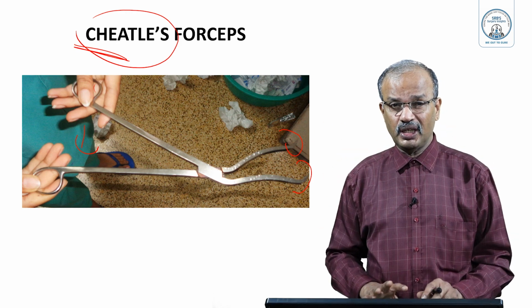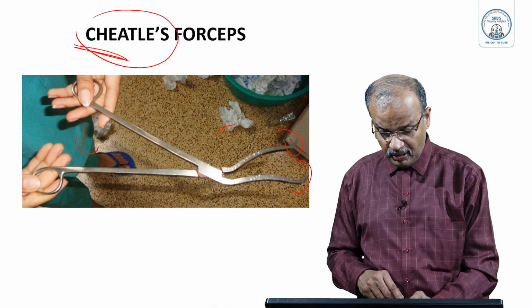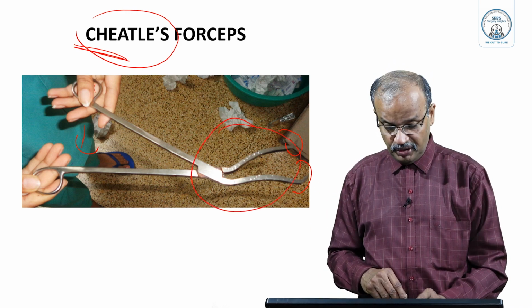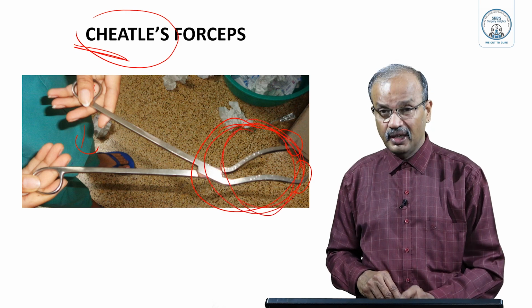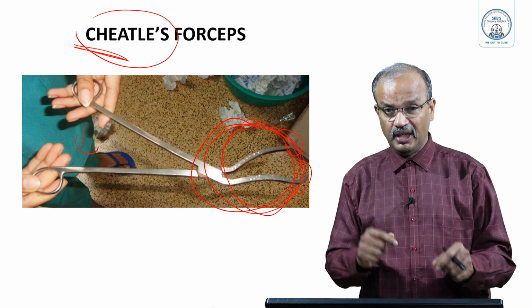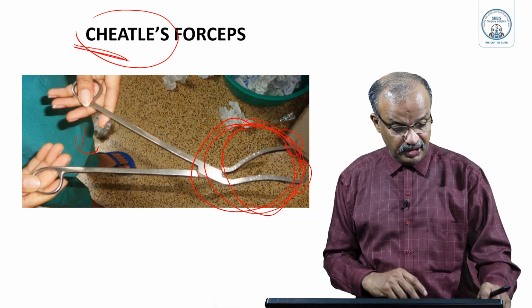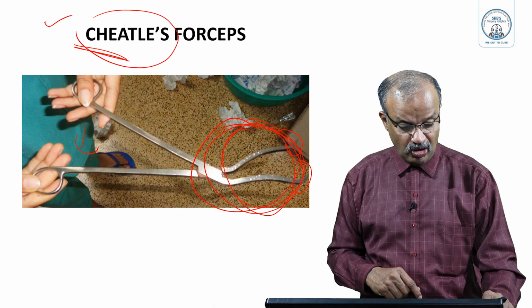This is used in the OT or in sterile area or in surgical ward also. This tip is dipped in the sterile solution so that it is aseptic. It is actually sterile. In the aseptic solution it is dipped so that you can always take and hold instruments and carry them, so that the instrument is not contaminated. That is the idea. This is Cheatle's forceps. Remember, it's very commonly used.